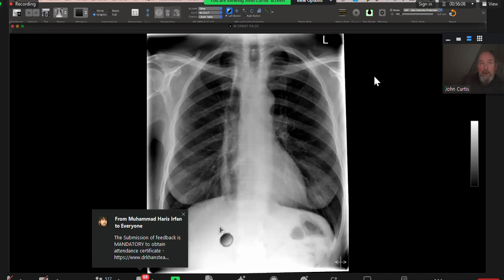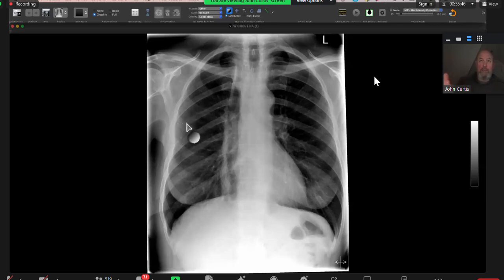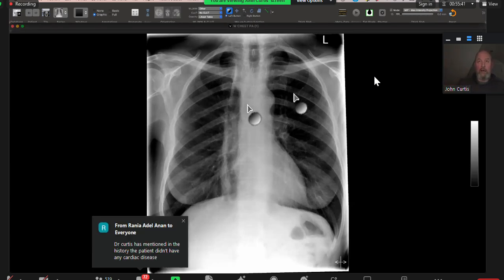And what does the surgeon do to the rib to get to the esophagus to remove it before the gastric pull-up? They take some of it away. Yeah, remove part of it. That is the hallmark of a gastric pull-up. So you've got rib surgical resection, deformity, and you've got a thick-walled viscus that looks a bit like the esophagus, but it's too thick-walled. That's a gastric pull-up.